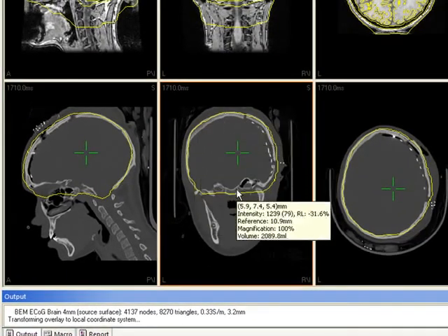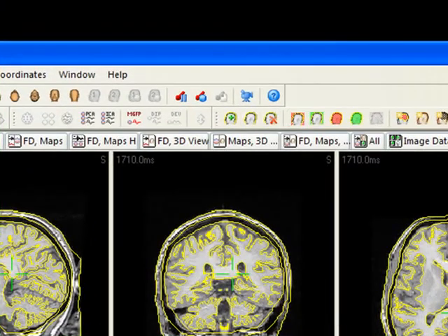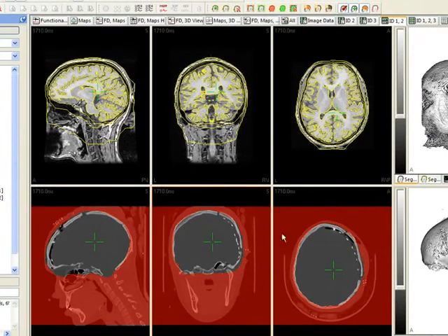So now you see we've got it here, and what I want to do is turn everything outside of that area into stop markers. Stop markers just means that those areas are not going to be included in segmentation. So now we can delete the boundary, and now we're only going to be considering what's in the gray areas.